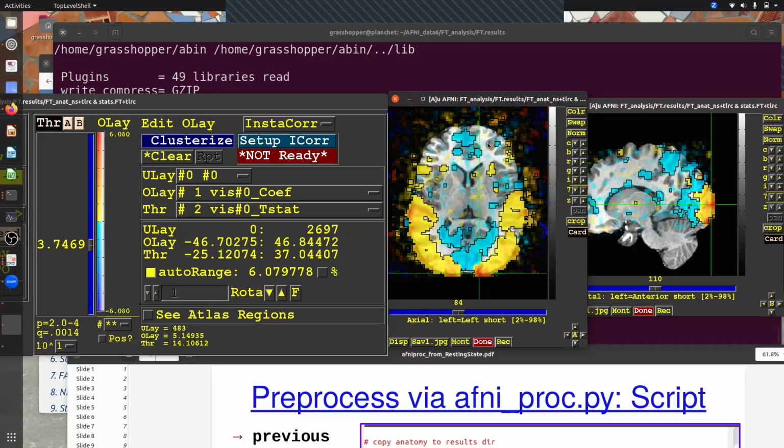I'll give you a hint, 20%. Going to 50% is the wrong direction. And if you remember, even here, all that stuff outside the brain was at 6%. Everything here is much smaller. Actually, what should we set our color bar range to? Maybe the most we might expect is something like 2 or 3%. That's actually a really strong response for a very strong signal. This goes along with the phrase, fMRI data is very noisy.